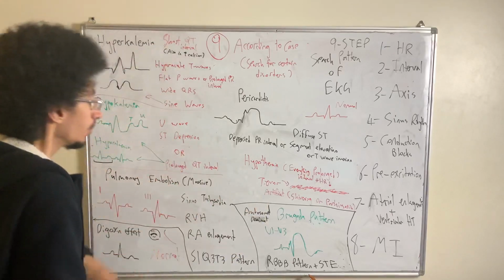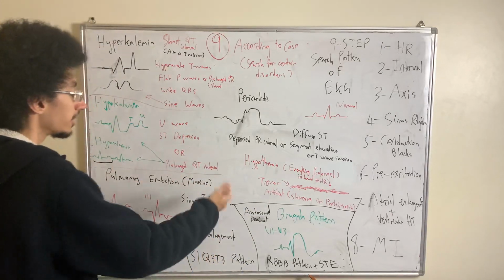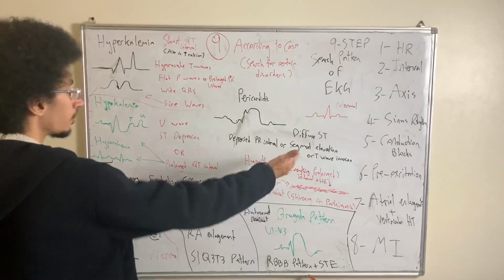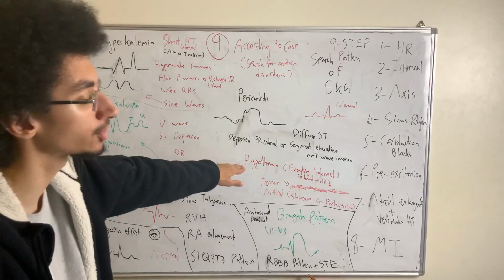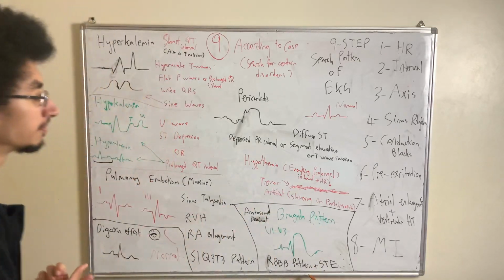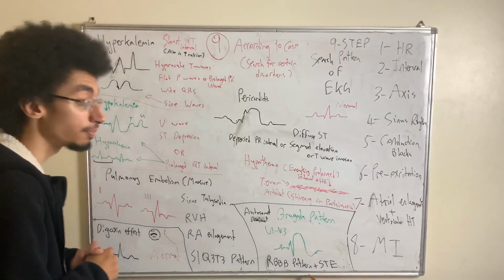So, this is if the patient is not shivering. If he's shivering, then another finding of hypothermia is a tremor artifact, okay? So either prolonged intervals with bradycardia or a tremor artifact you'll see in people with hypothermia, or in people with Parkinson's disease or Parkinsonism, or people with seizures. Alright, now we finished with hypothermia.